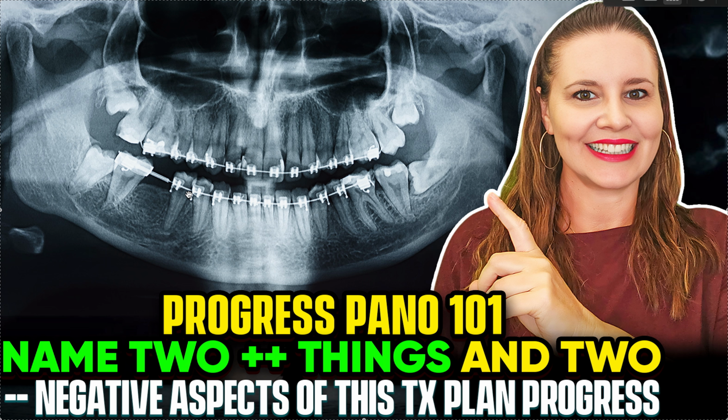I do see 4 wisdom teeth that should have been pulled out. Why are they still there? Obviously, this is one of those cases where probably the doctor said, hey, get these out. And the patient said, hey, can I not? And the doctor said, hey, can we try? And then they made a mistake. So, okay, please take wisdom teeth out in these cases. I would never have touched this case. So if this case came my way, I'd say, nah, not touching this till wisdom teeth come out.